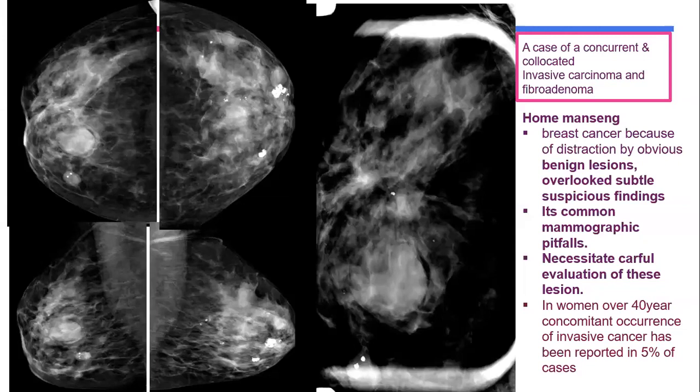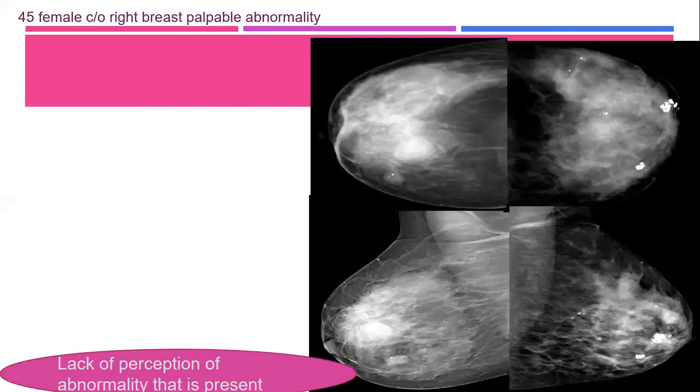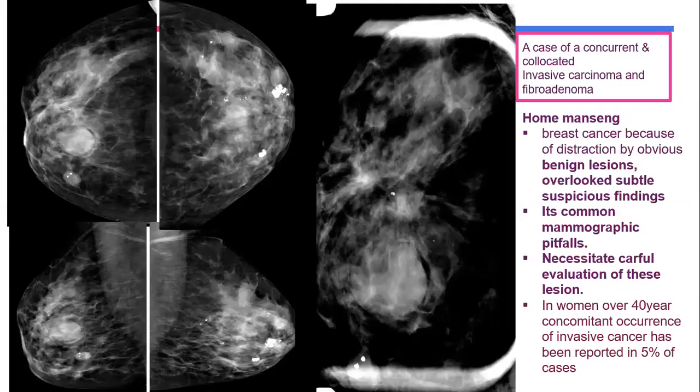And this is her follow-up. And even the technique, the mammographic image here, it was not much better than this. And here, obviously, the distortions and even, you see, the circumscribed fibroadenoma, the wall adjacent to the cancer is being infiltrated by the malignancy.